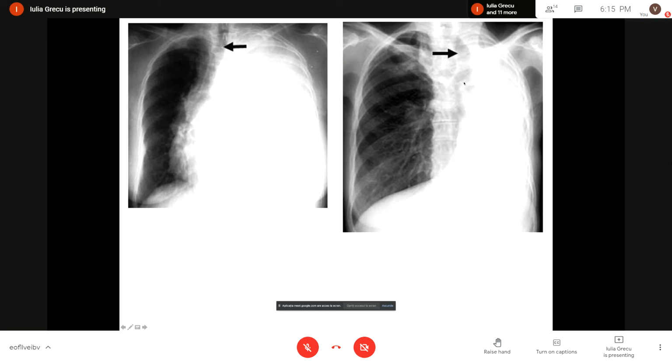So most probably there was an obstruction of a major bronchus in the left lung that led to a total collapse of the lung, because it's the only explanation why all the structures of the mediastinum are tractioned towards this huge opacity, a retractile opacity that is probably due to a collapse. So the entire left lung collapsed, and with it, it tractioned all the structures of the mediastinum.